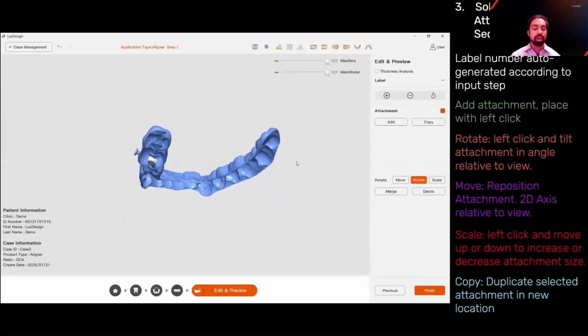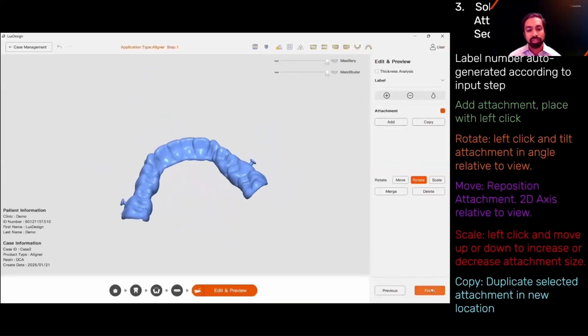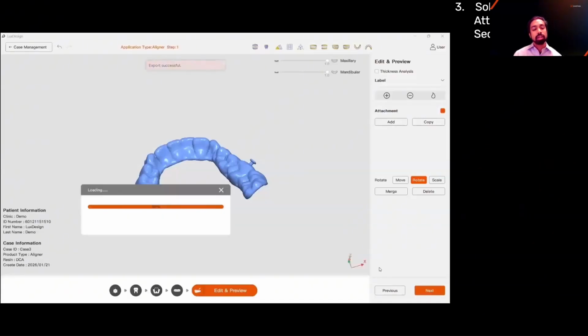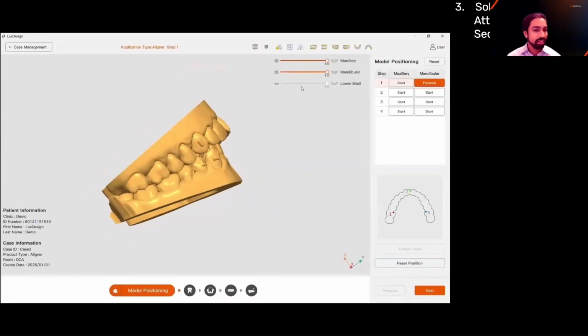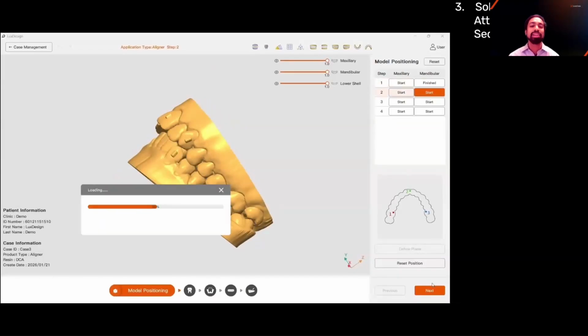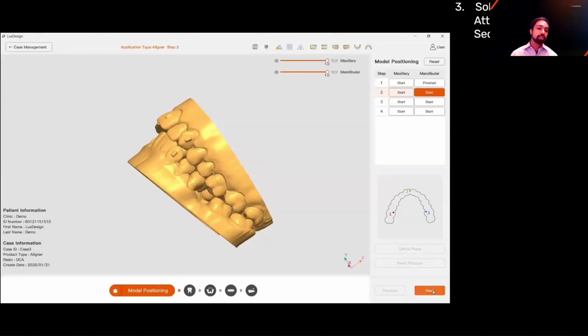You can see the solid Pontic in the bottom. And now I'm going to finish. And so that's done. And now you might think, hey, all right, so I did all that, but do I really have to do all that positioning and all that shaping for all eight appliances in this? That's going to take me forever. The answer is it's not.